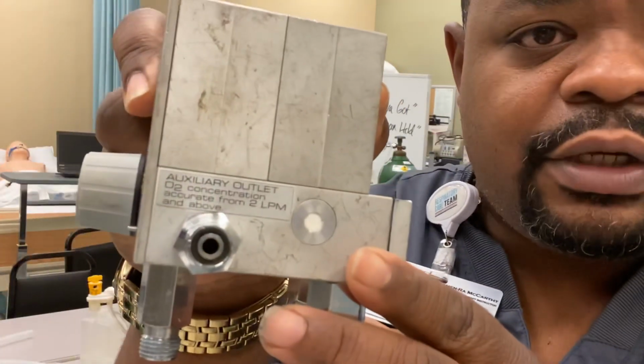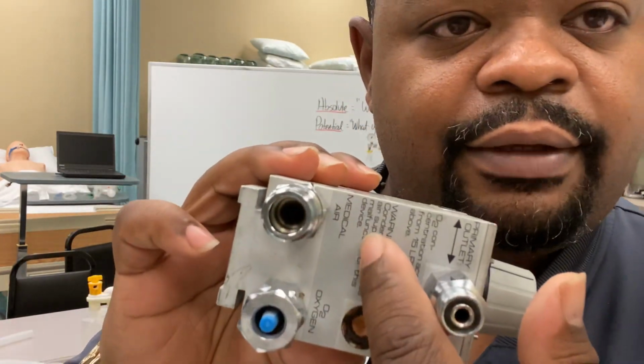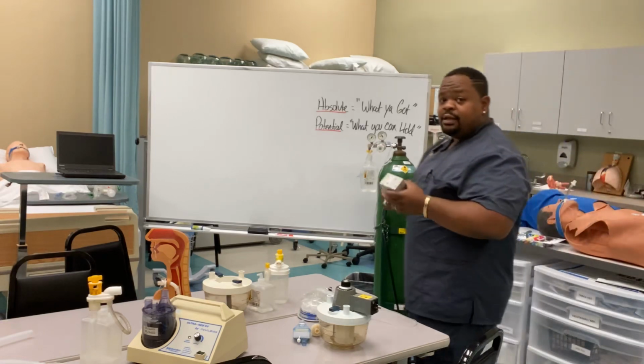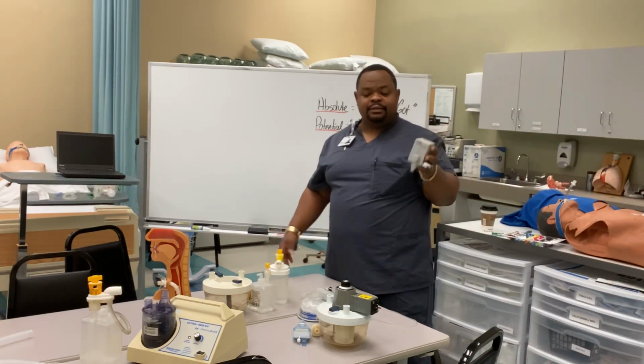See, it tells you hook up your auxiliary oxygen here, and then you'll have your air, right? This is your air here. And then, of course, this is where you will hook up your device. And then I can just turn this to what FiO2 I want, see? Now I don't have to worry about an analyzer, right? I can just use this, and this should give me the FiO2 that I want. Now, always use the analyzer to check it once a shift. You want to make sure once a shift that this is right. Because what if this says 100% and they're only getting 30%, right?